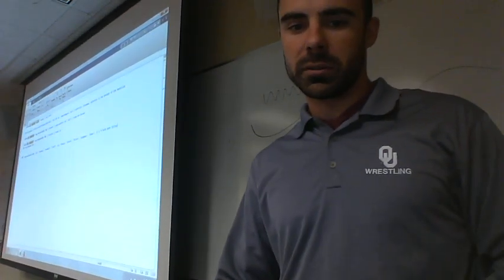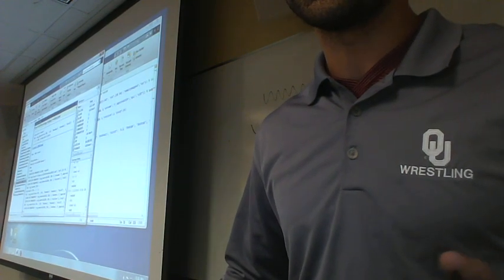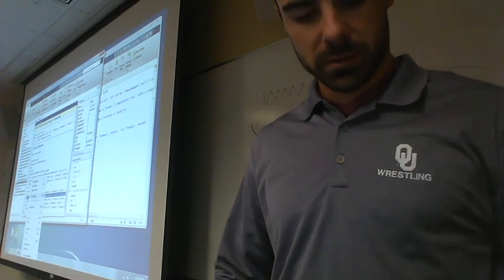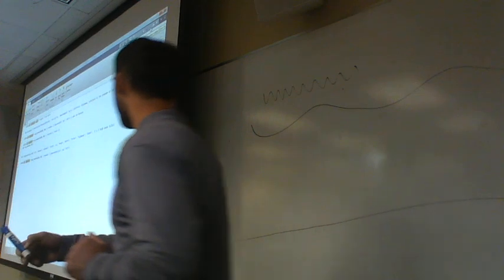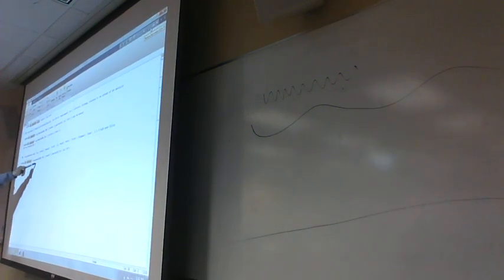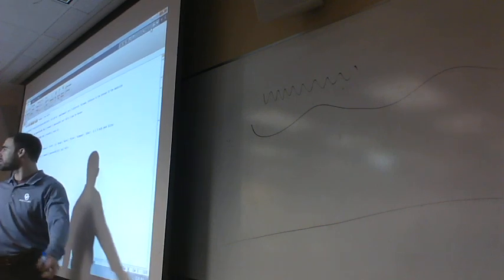Now, what we also did is, when we were here, we then saved that as well. And here, it also shows us the command that we did to save it. So now it says we have a new data set. I'm going to save it. What's the name that we save it with? It has that filter at the end. And that's it. Yes?